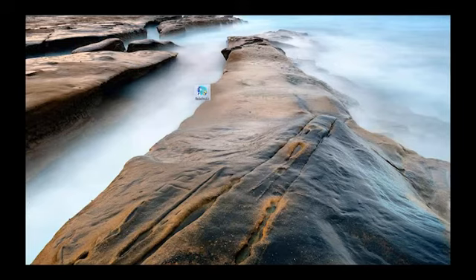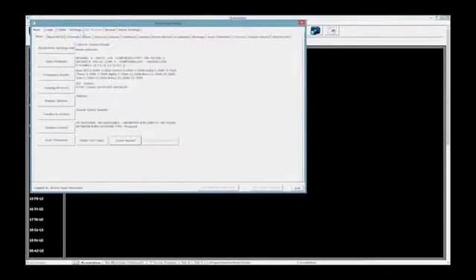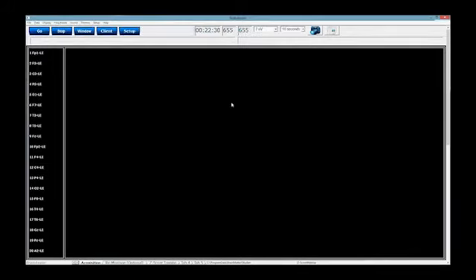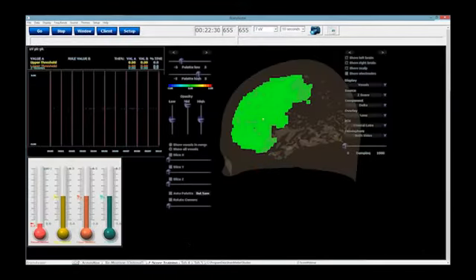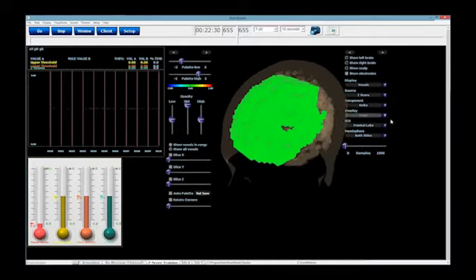Now, let's look at how you can do some different things with this. You can change the region of interest to whatever you want that is a region of interest in our system, which we have all frontal lobe, or we have all lobes, all gyri, we have Brodmann areas, and we have a special new feature of some network hubs that are also available for the single region of interest training. To go through all the different names of them, they are all right here.